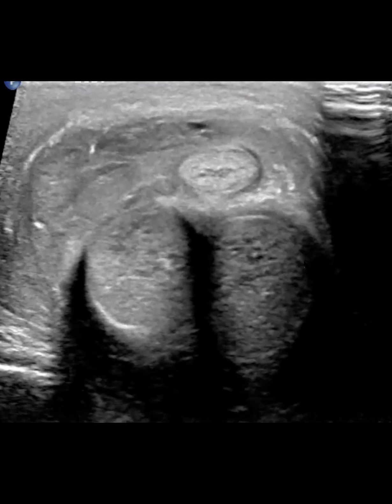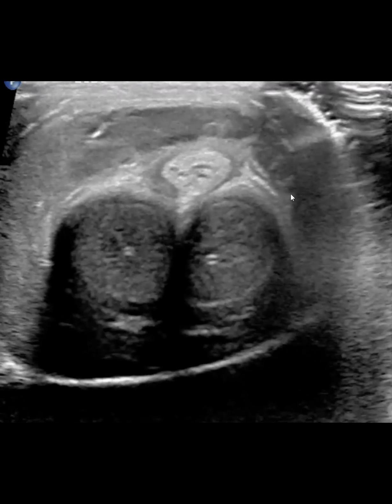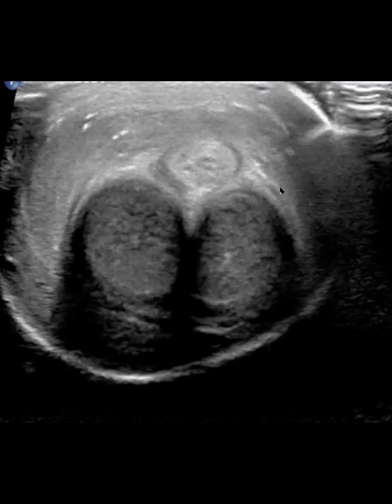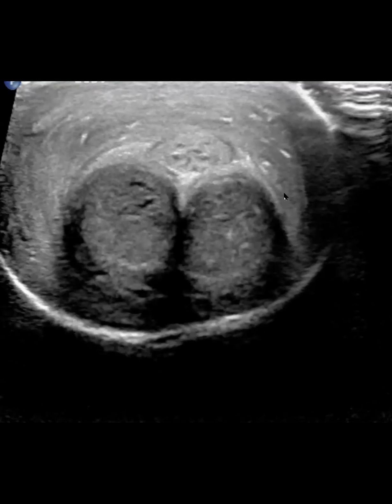This is kind of a textbook picture. Trauma, any history of trauma? Indeed. So this is like a classic penile fracture. So this young gentleman presented to the ED with the classic history that predisposes to penile fractures.